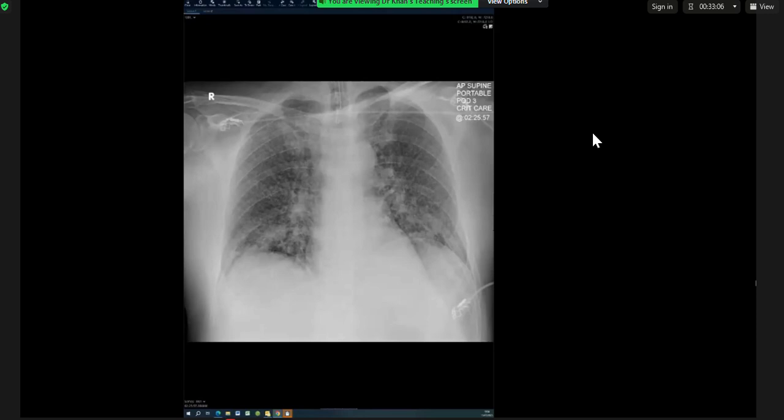So this could be a non-cardiogenic pulmonary edema. Okay. What else can it be? You describe them as nodules. Let's stick with that thought, that they are bilateral nodules. It could be miliary nodules, as in metastasis or due to an infectious cause. Or fungal infections also could be.